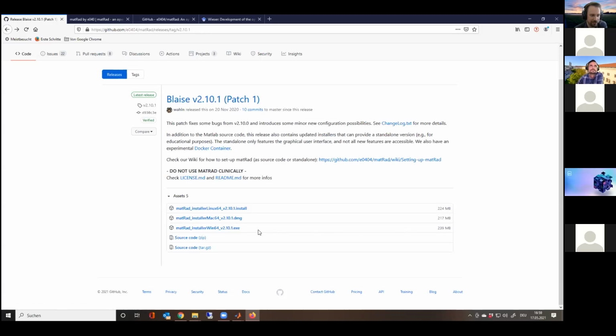It should work with Windows 10, where the best testing is done, so this shows the fewest problems. With older systems, we sometimes have a weird bug that occurs with OpenGL, but I think I fixed this, so it should also work with Windows 7 and so on. If you experience problems, just tell me.